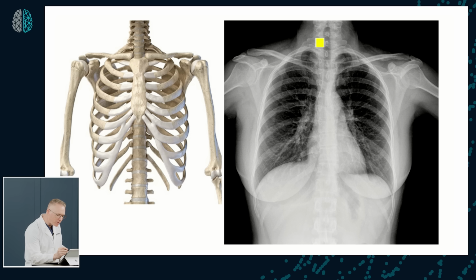I'm going to highlight for you the posterior rib. So here's posterior rib number 1, okay? And then here's posterior rib number 2, 3, 4, 5, 6, 7, 8, 9, and then you can see that 10 sort of falls off. So remember that 8 to 10 posterior ribs becomes very important, right?